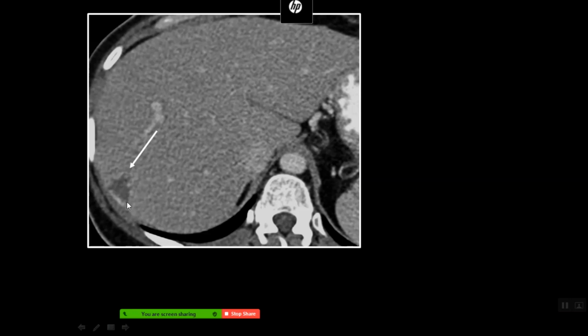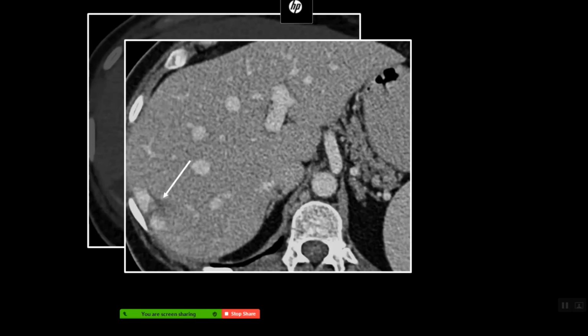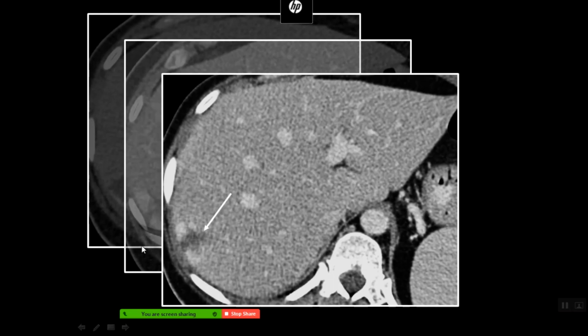So here, see, this is not very nodular enhancement, right? This is a curvilinear sort of enhancement here, and here you can see some nodular enhancement, right? This is discontinuous. And then you're like, well, is this hemangioma, is it not, right? So you can see some peripheral discontinuous nodular enhancement here, but then here it's more curvilinear sort of enhancement. So you're not sure, is it met, is it benign? You go to the next scan, now you see more globular pools of contrast. You go to the next scan, again you see more globular pools. So every scan will look different, right? When that happens, then this is a hemangioma. Okay, this is a definite hemangioma.